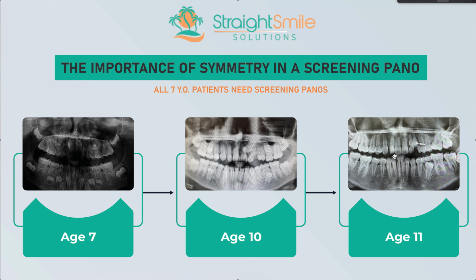So just wanted to show you again the importance of symmetry in a screening pano. Once you see it, you can't unsee it. A lot of you are not looking at symmetry, so take the time to look. Whenever you see something strange, see if you see something strange on the other side. And if it isn't, it's probably a problem.